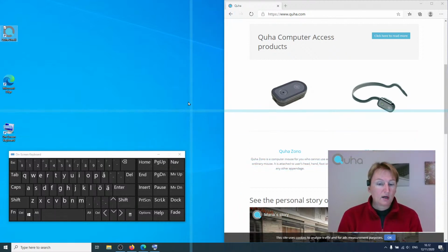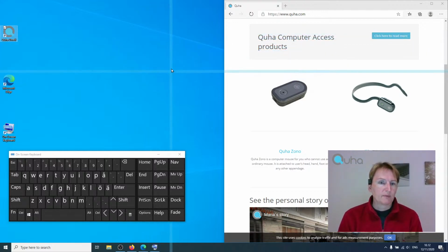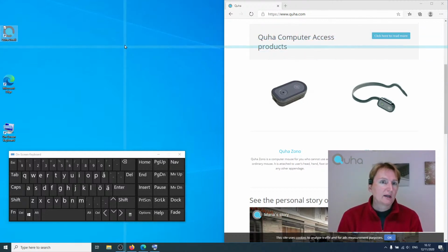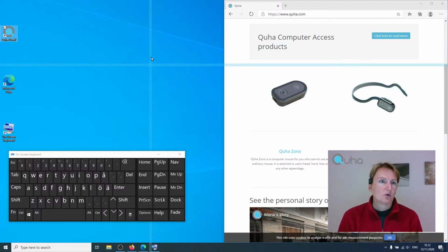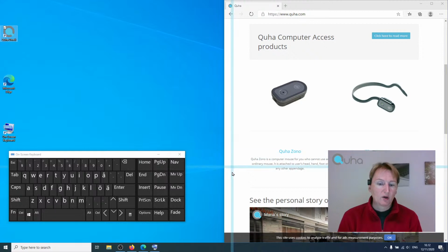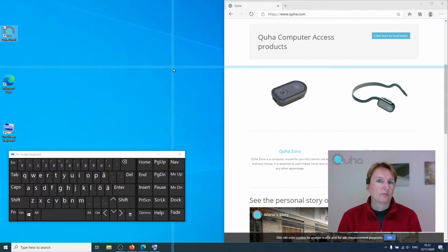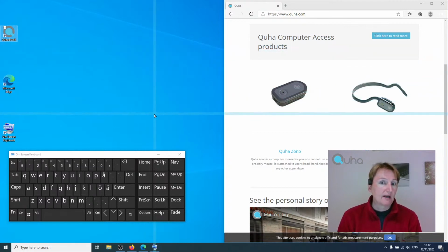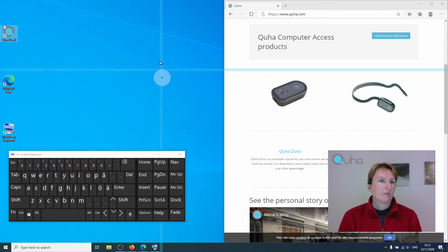I think those are the very typical features. There are actually lots and lots of features, but just to make sure that this is a short enough presentation, I will not demonstrate many more features here. So those would be very typical. There are lots of features like copying, pasting, opening a browser. You can set those onto those menus to make things very quick with the computer. The basic clicking features I have now demonstrated, and perhaps I will just move forward.